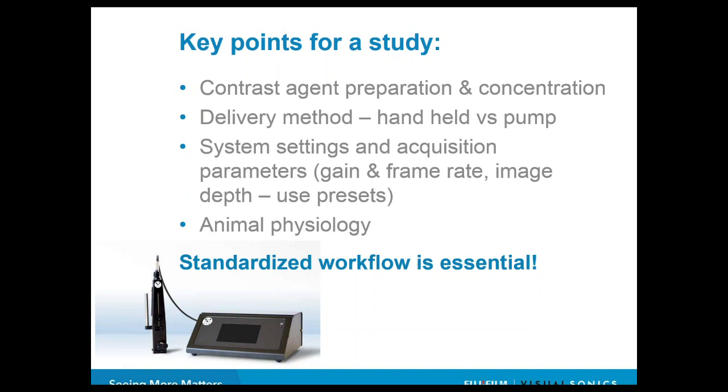And you also should make sure that you keep the system settings and acquisition parameters quite constant, and here I can only suggest that you always use the presets to make sure you are consistent in your workflow. And as a last point, animal physiology is also quite important, and you should always make sure to keep the physiology as close to the normal level as possible.